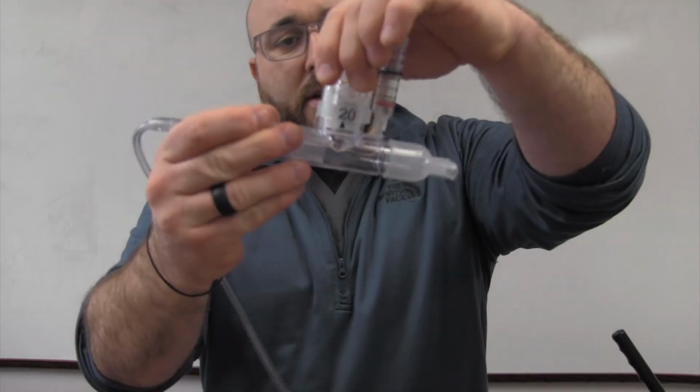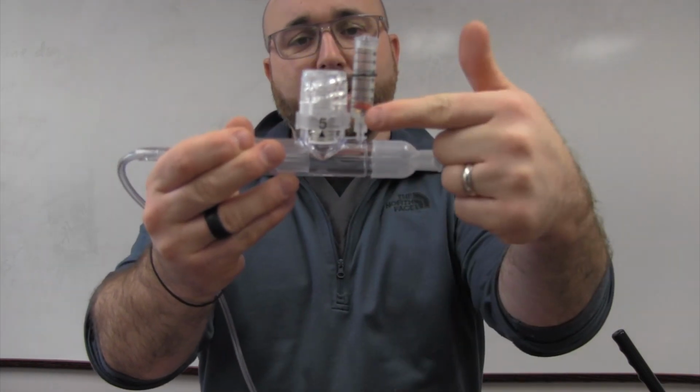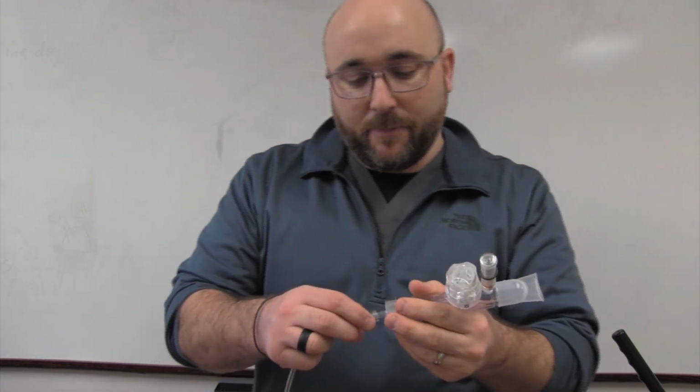So let's start really easy. At 5 of expiratory resistance, we're going to watch our manometer. A couple real keys when I do this device, if you're teaching your patients, you want them to keep tight cheeks. That's really important to forcing the air down to where it needs to go. Having your cheeks loose really absorbs a lot of that pressure up in your upper airway, which does absolutely nothing for recruiting alveoli. You want to force it down. Tight cheeks to get that air down to where it needs to go. So that's really important. Let's hook it back up and I'll show you.